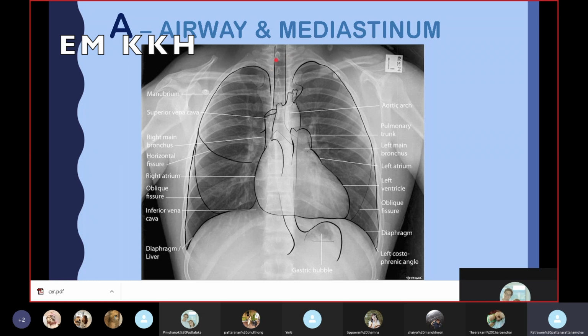If there is significant deviation, check that the chest X-ray has normal rotation. If the film has normal rotation but the trachea is deviated, this is true tracheal deviation. Look for pathologies that push the trachea, such as effusions or pneumothorax, or that pull the trachea, such as consolidation or atelectasis.